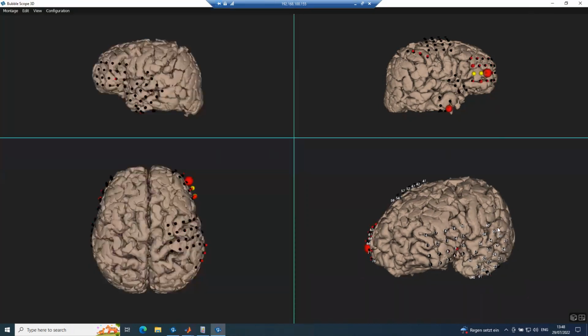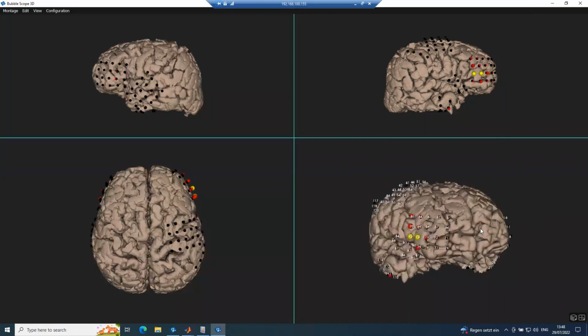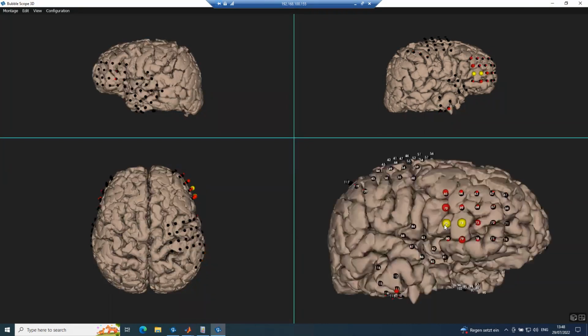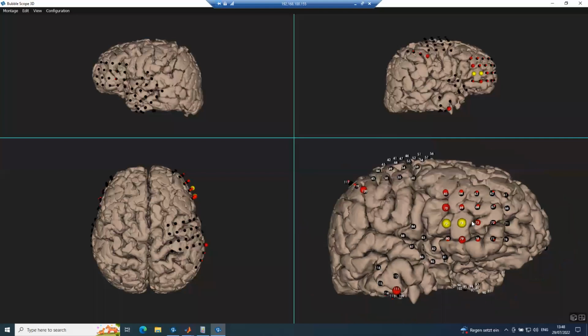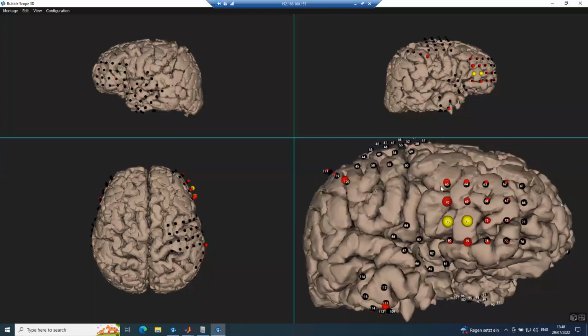And we see here the two yellow spots are the stimulation site. These two electrodes were used with the g.HIsys Pro and the switching unit to stimulate the cortex. And all the red bubbles that we see here, these electrodes show the EP N1 response. This tells us that these areas or electrodes are connected with this brain site.